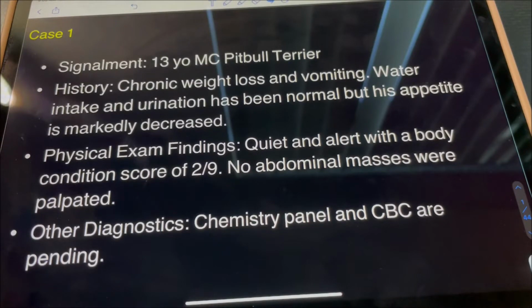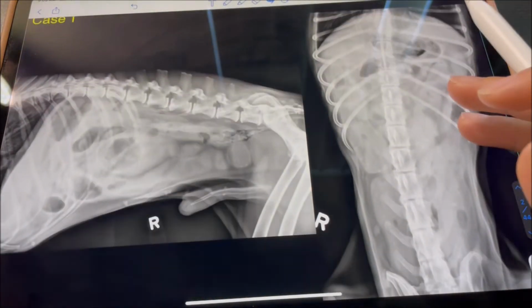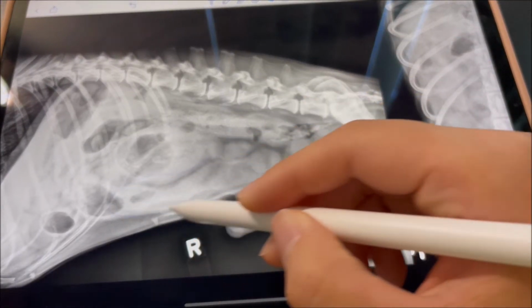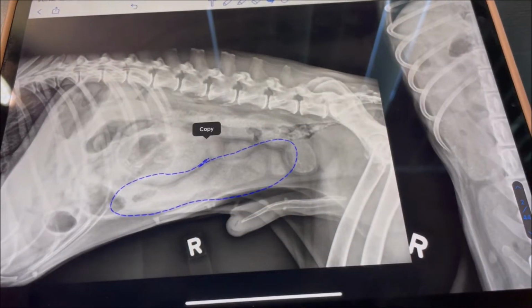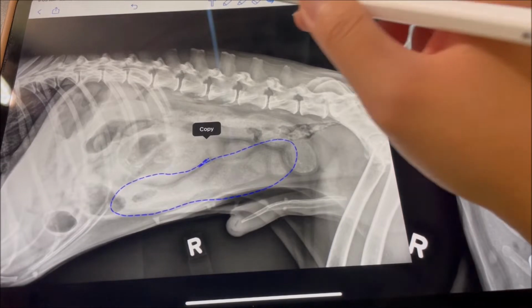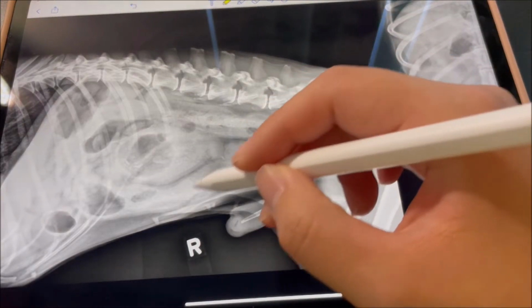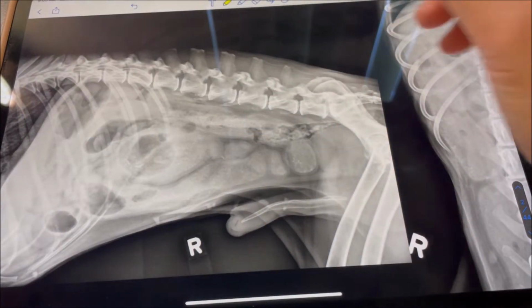All right, case 1. The bowel loops look dilated. Is it pathological? Well, to figure that out, we have to compare it to the height of L5's vertebral body, and if it's greater than 1.5 times, then it indicates pathologic enlargement. So let's do the small intestine first.